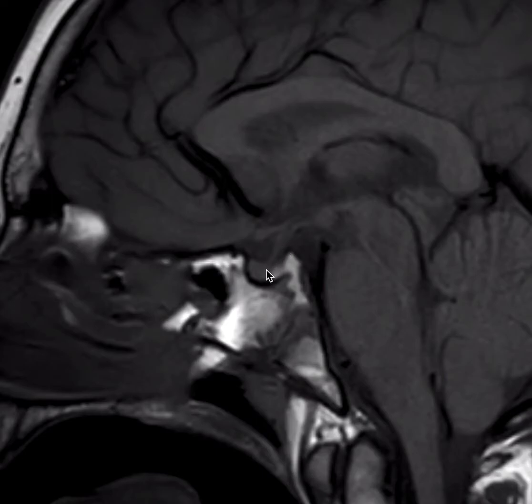We'll notice that it has an anterior portion, which is more T1 isointense to the rest of the brain tissue, and then a more posterior aspect here that is T1 bright. The T1 brightness here is attributable to vasopressin. The anterior lobe of the pituitary may also have increased signal on T1 weighted sequences in cases of hormonal hypersecretion, as will be seen with pregnancy, lactation, or in the early neonatal period.